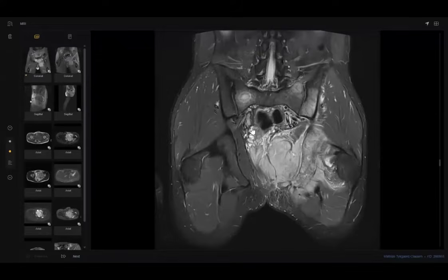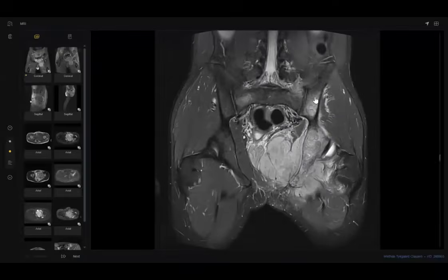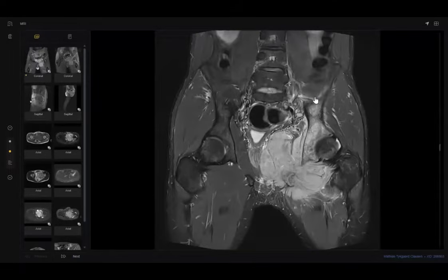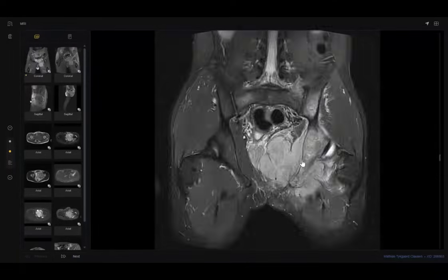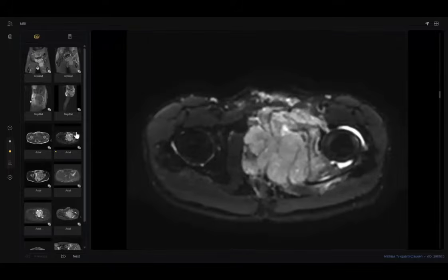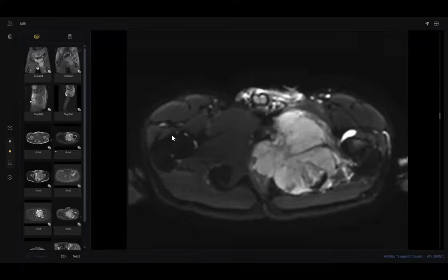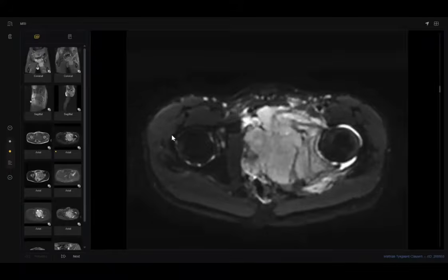Look here, this is very important. So this is a large soft tissue mass infiltrating, not a permeative or destructive lesion. Next, when the examiner asks you about the treatment, he means treatment, not the next step.